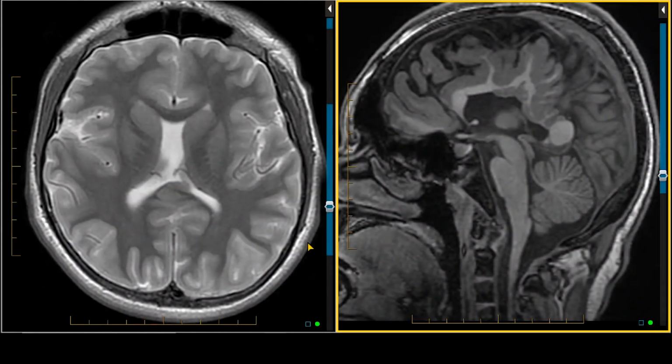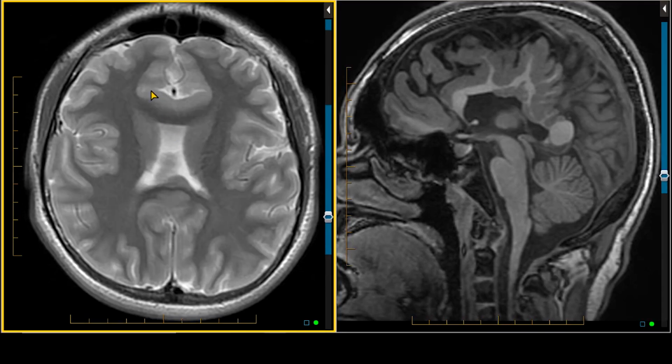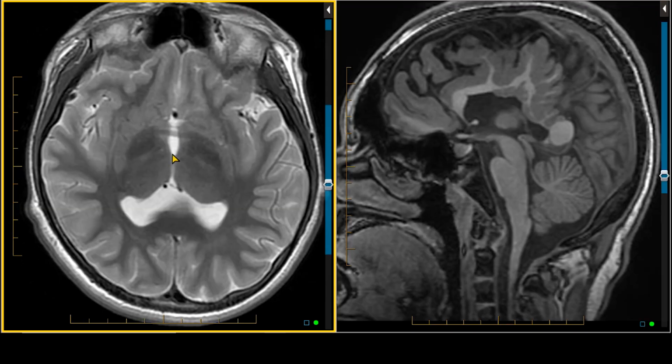This is an MRI of the brain in a 13-year-old with developmental delay as well as some seizures. And there's several things that we see. First of all, in this image, we do not see a septum pellucidum. If we go up, we actually see there's midline continuity of gray matter across the anterior aspect of the interhemispheric fissure. Now, if we go down lower, we see two separate thalami.